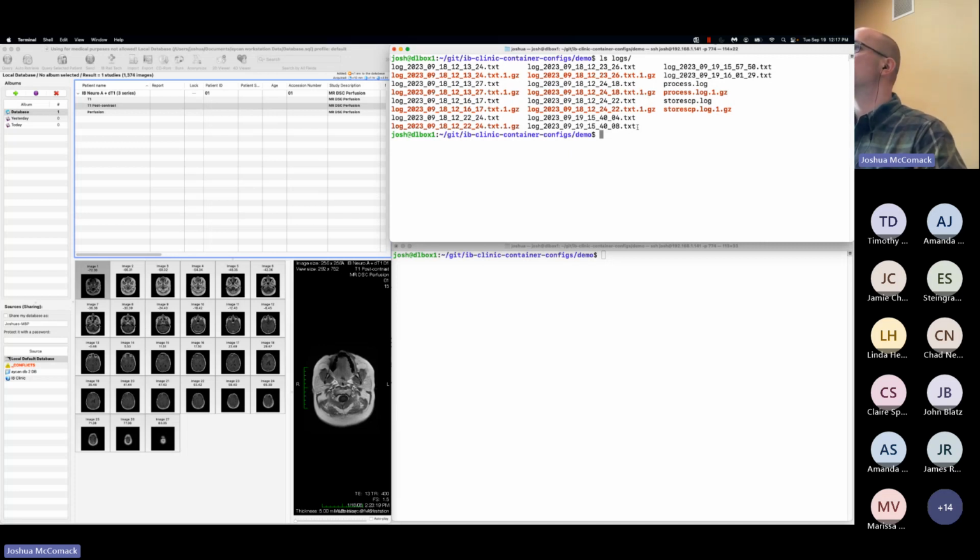And then we also have specific execution logs, which are case-by-case logs. For any given processing attempt on a module, we will output additional information in these time-stamped logs here.